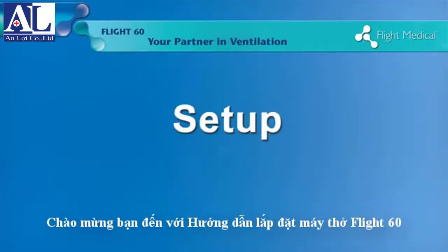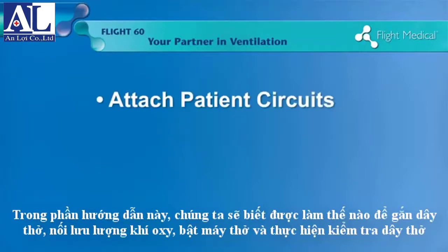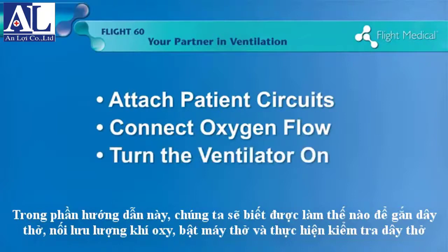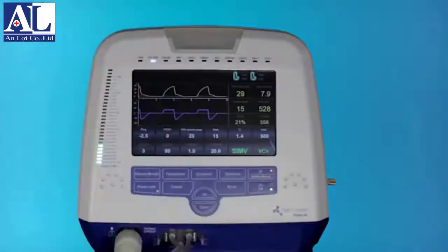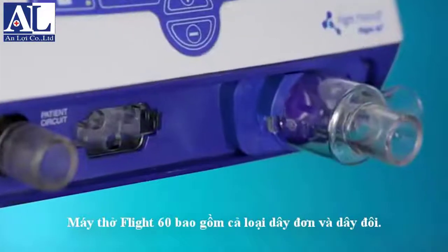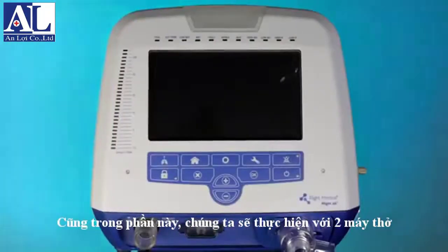Welcome to the Flight 60 Setup Training Module. In this module, we will learn how to attach patient circuits, connect oxygen flow, turn the ventilator on, and perform a circuit test. The Flight 60 ventilator is available in both single and dual limb options. In this module, we will demonstrate both ventilators.